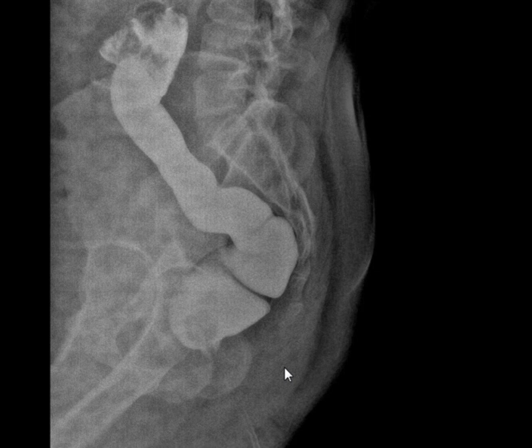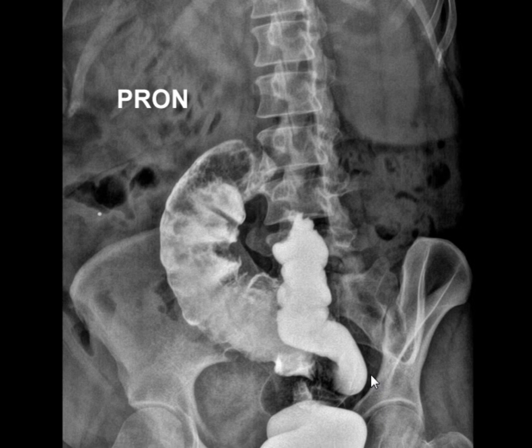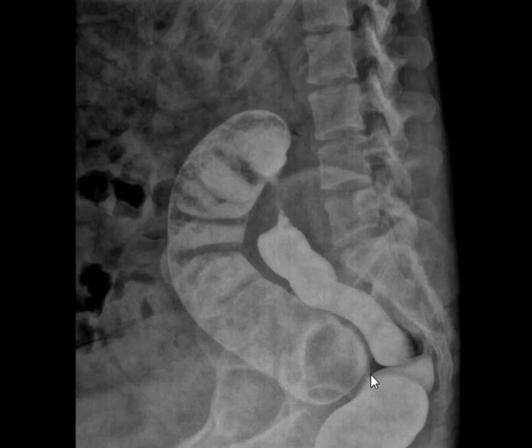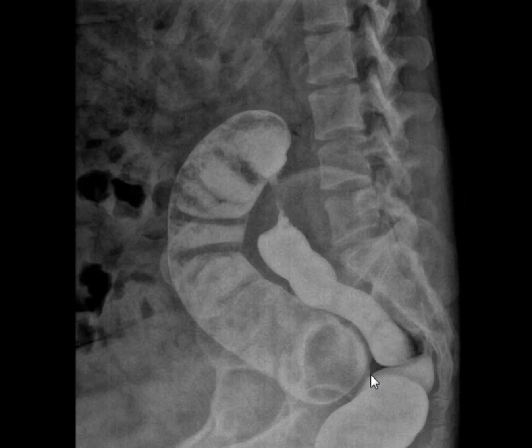Again, a 32-year-old female patient, abdominal pain. What's the exam? It's a pelvic X-ray. Okay, pelvis. Scroll. Is this how you see pelvis? No, abdominal. So, what's the exam? Abdominal X-ray. Again, barium? Of course. What kind of barium? Barium enema. Excellent. Barium enema showing what? Stop here.